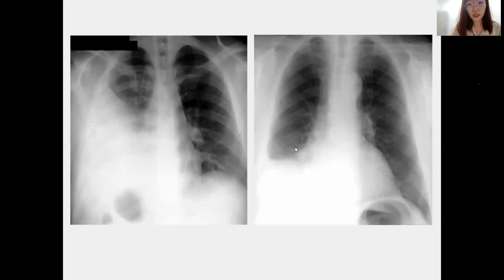So this X-ray, easy. I think everyone should know, right? So these are pleural effusions. Everyone must know, right? Pleural effusion, blunting of the costophrenic angle with meniscus sign. Okay, so let's see how gross is the effusion on both sides. Even when we see just a little bit here, when we scan through the ultrasound, we can see a moderate effusion already. All right.